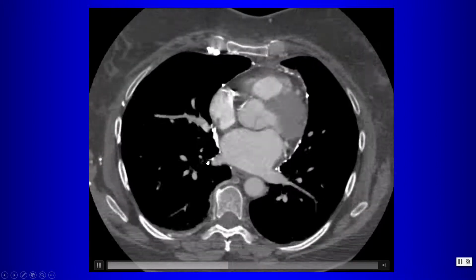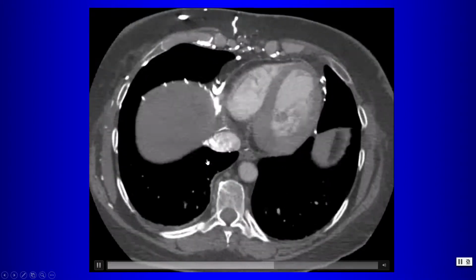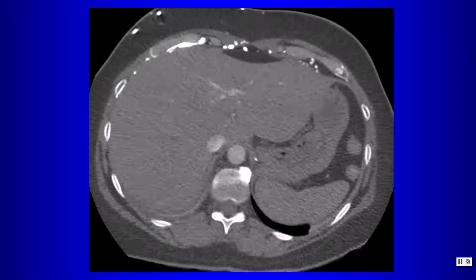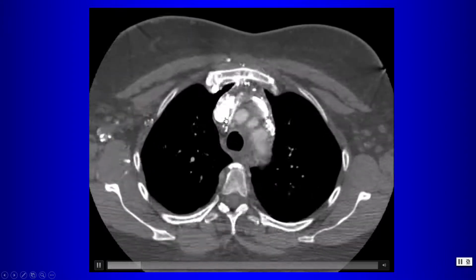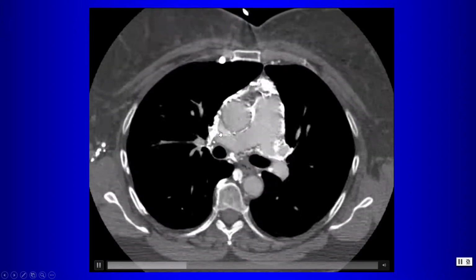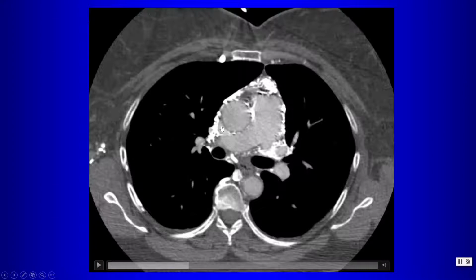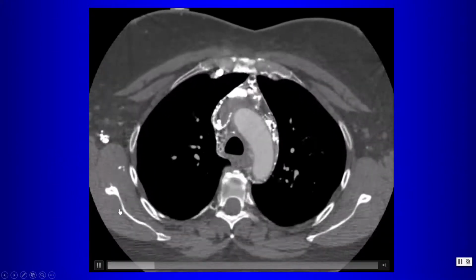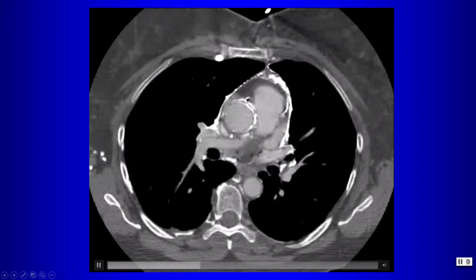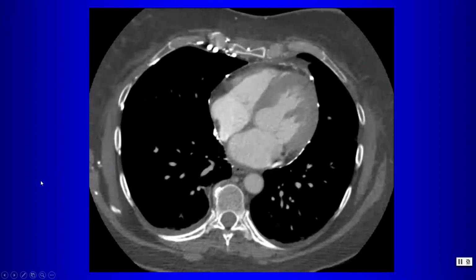Now, what is interesting here is just below the obstruction, just below that thrombus, if we look at the superior vena cava below the thrombus, so let's follow that as we follow right below the thrombus. Here is the superior vena cava. It is opacified, but it is not as dense as the collateral vessels or the undiluted contrast that we have injected into the right arm. So there's the dense contrast. Follow that down, and there's the superior vena cava just above the right atrium.